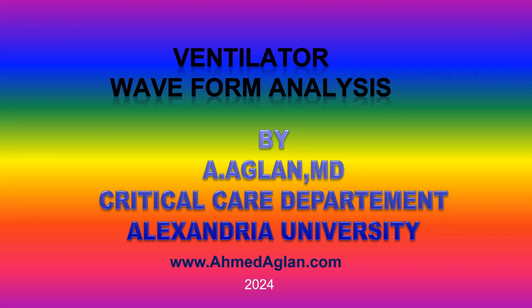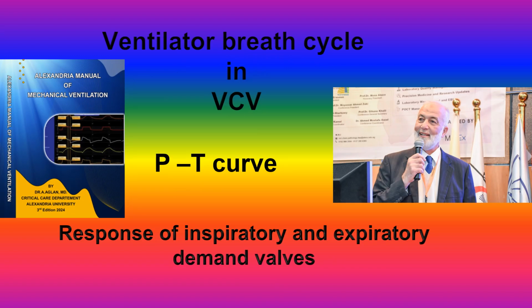Ventilator waveform analysis. Ventilator breath cycle in volume control ventilation, or the breath delivery by the ventilator during inspiration to the patient in volume control ventilation. This can be analyzed by studying the pressure time curve and seeing the response of the inspiratory and expiratory demand valve, which means when it opens and when it closes.